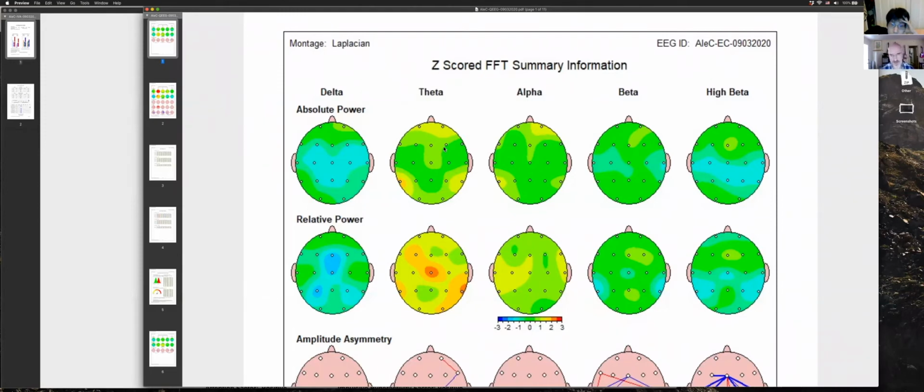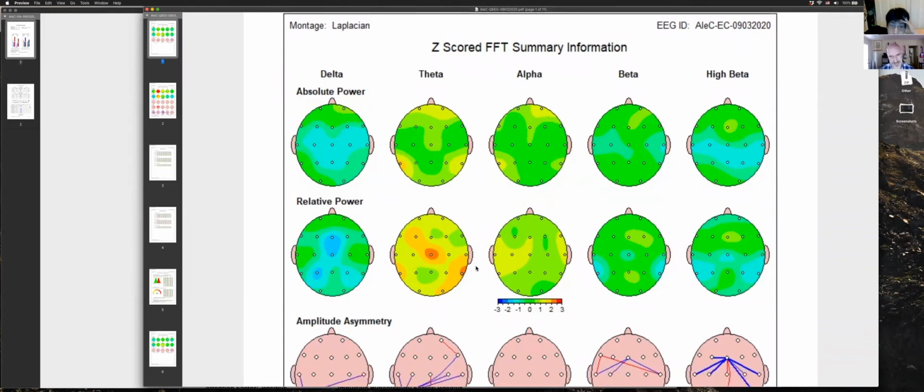Okay. So looking here at the first page, I see a little bit of stuff next to the ears, right here, behind the ears especially. And this is usually auditory cortex or even sensory cortex on the right. So this looks like it's a little more active on both sides here behind the ears than is typical in theta brainwaves.